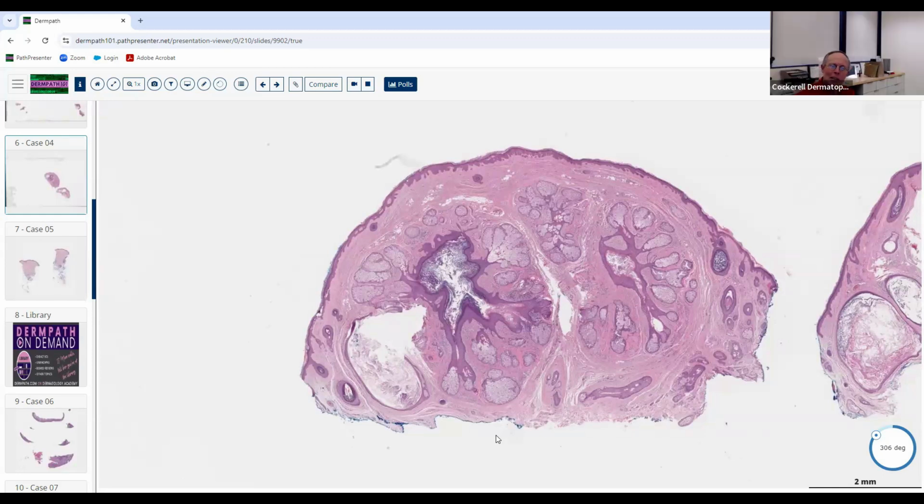Is the main criterion you use for whether something's neoplastic just whether there are inflammatory cells or not? Because you get some neoplasms with no inflammation. Well, I guess it also just looks pretty well circumscribed. But there's something here that doesn't normally belong here, right? All these sebaceous glands.